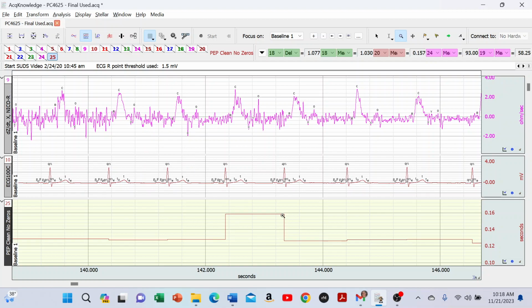Now we get these, which don't look terrible compared to the zero values, but they leave a lot to be questioned. So what we need to do is go in here and take a closer look. I found the scale that allows you to see the next level of problems is to double click on this x-axis here.